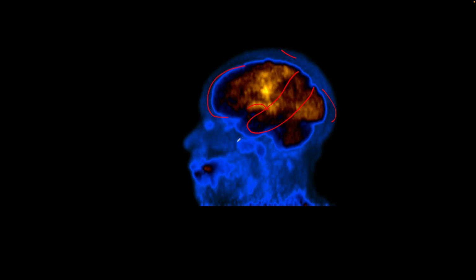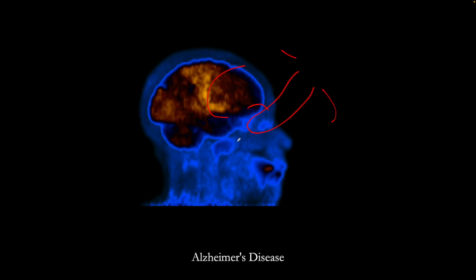So this patient has severe Alzheimer's disease, and the findings that I just talked about are characteristic of Alzheimer's disease on FDG PET.